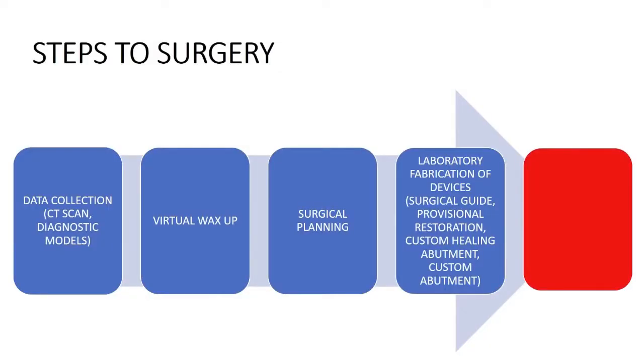Okay, so let's move on. The next thing now is I've gone ahead and done a virtual wax up, or the laboratory has. They've created a surgical plan. I've validated it and said, yes, I like that plan, or make these changes for me. Now they can make the other things that I request for them.